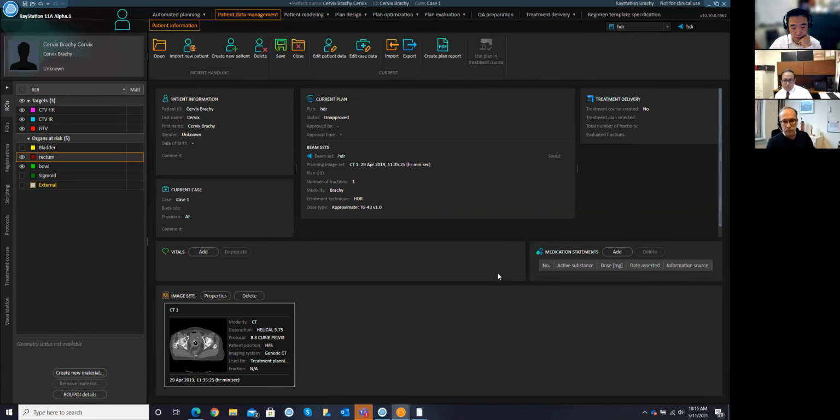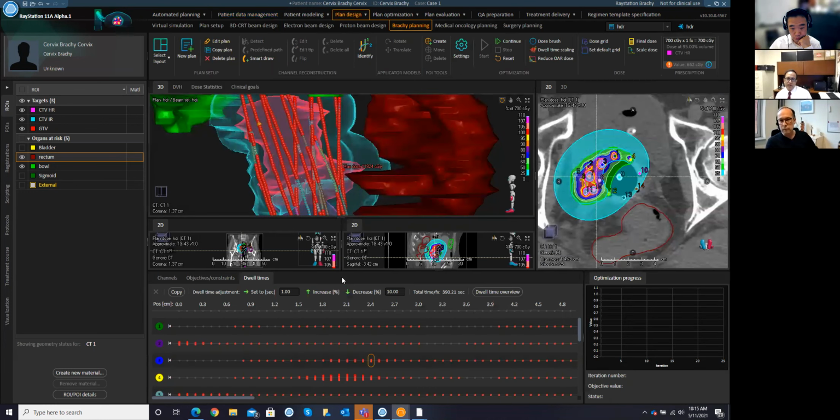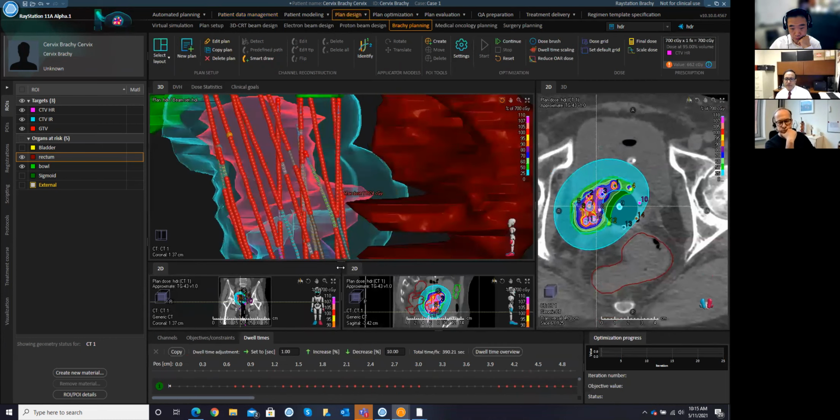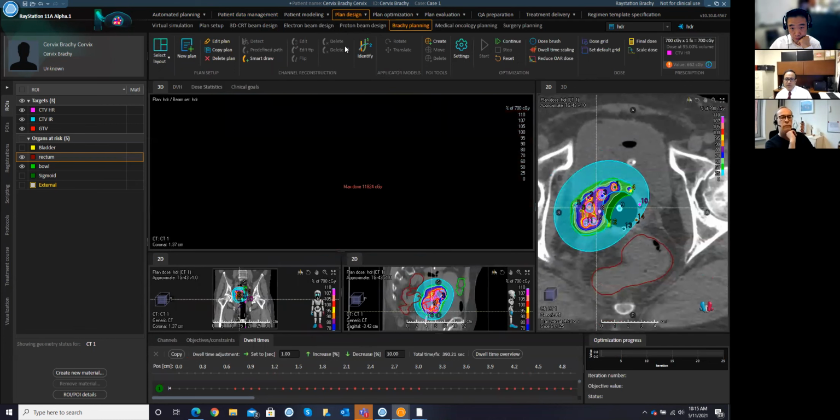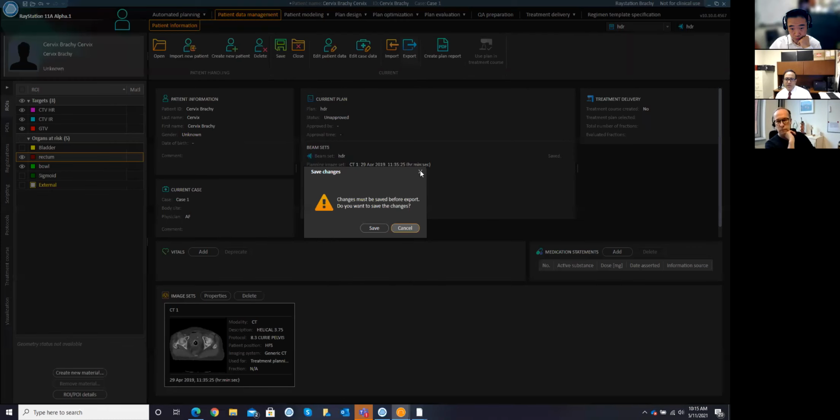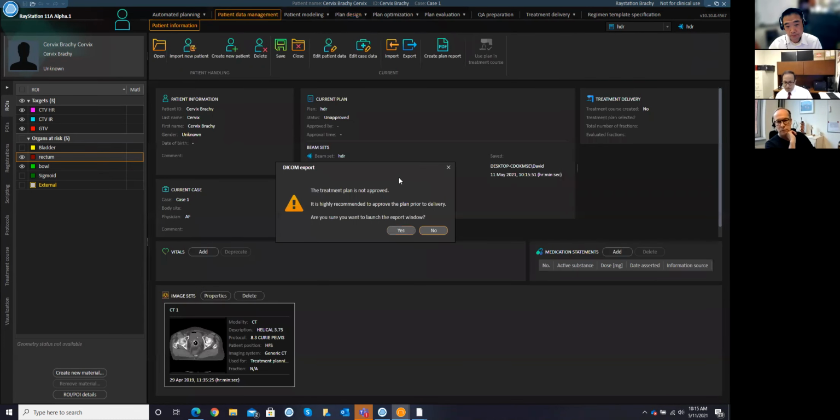Okay, I have a couple of questions. First of all, if I want to do a second check using another software, like RadCalc or similar, can it be exported to RadCalc to do the second check of the computation? So it'd be DICOM exported. DICOM export, okay.